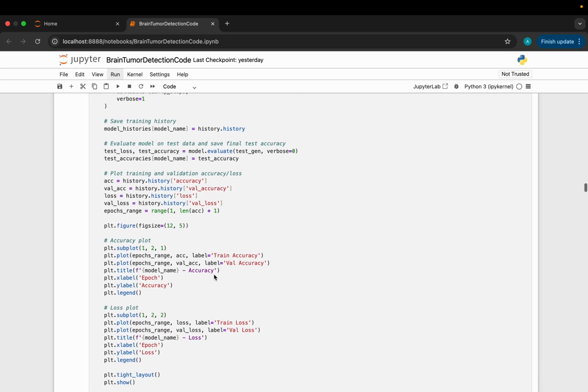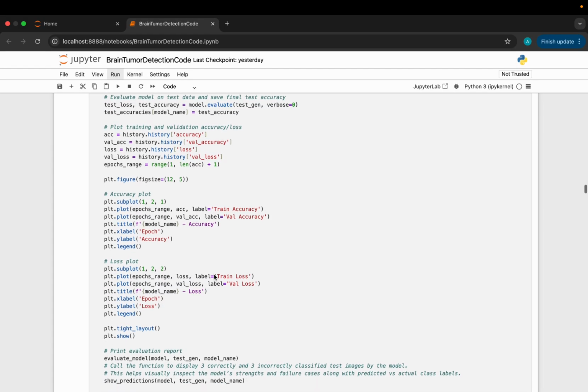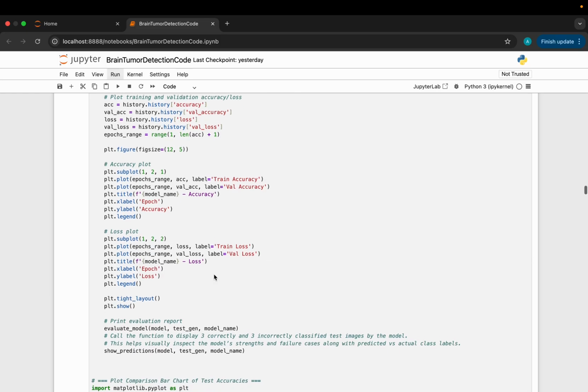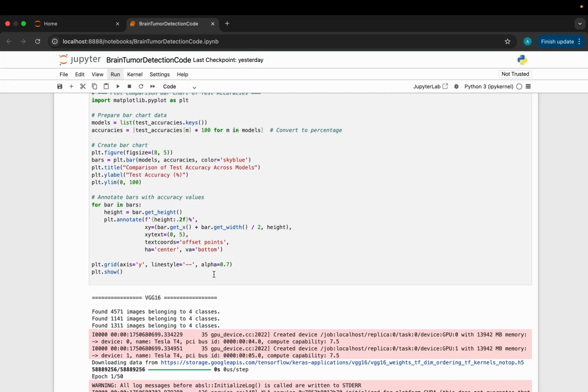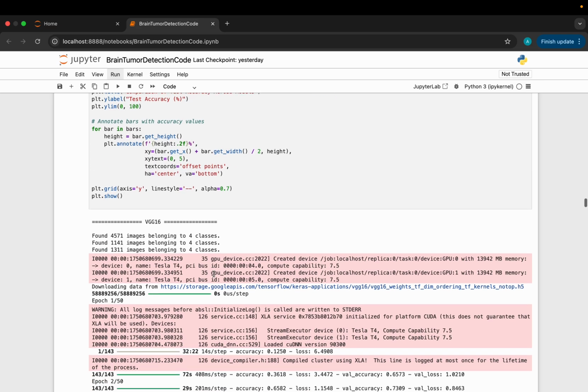You can see the pre-processing functions are model-specific settings, that means for the comparative experiments, we train multiple models. And lastly, we'll run each of these models through the training, evaluation and visualization, and find out which one is the most accurate for our classification task. So make sure to stick around, the results may surprise you.